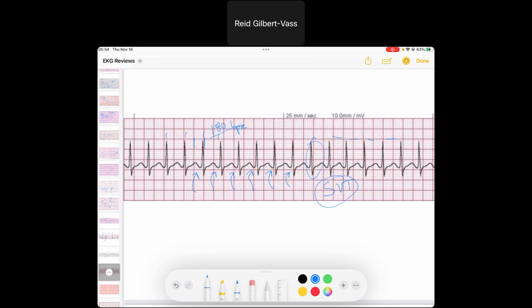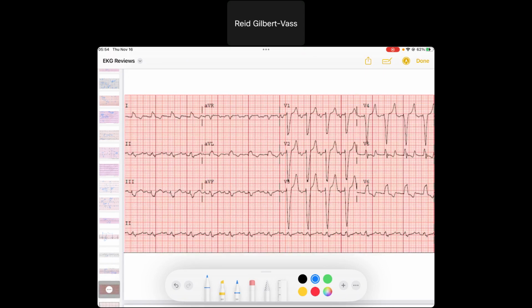We know that if they were symptomatic right this second and they needed some help, we could give them adenosine. And we could also shock them with synchronized cardioversion, really trying to reestablish the sinus rhythm. So it's interesting. All right, back to some 12 leads.